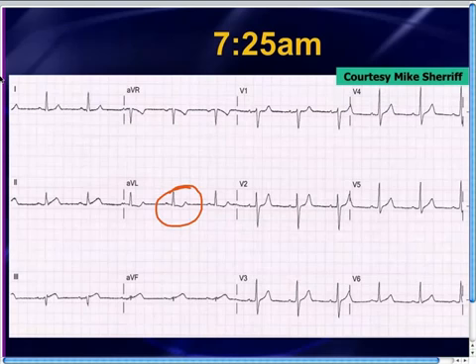What you'll notice is the morphology of the T waves is starting to become very, very straight. Remember, a normal T wave morphology, much like V3, normally T waves should be concave upwards. Take a look at V2 and V3. Those are nice and normal. Normal T waves should go concave upwards. These T waves in the inferior leads have become very straight.